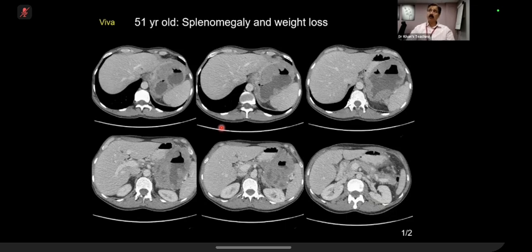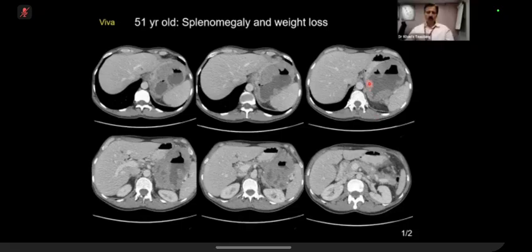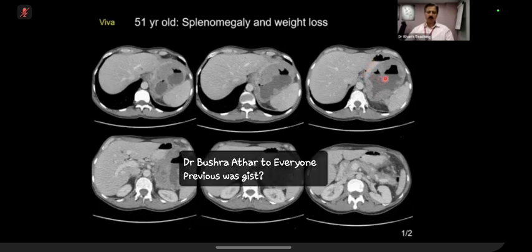Over to you, candidate 6. So, axial, what do you think is happening? So there's irregular thickening of the gastric wall. Do you think that the gastric wall is irregularly thickened where I am pointing out? Yes. Okay. What is this? And what is this?